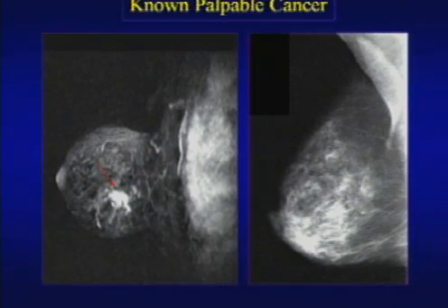So this is an example. A woman had dense breast palpable mass, which is mammographically occult. On the MR, again, everything I'm showing you is going to be post-GAD subtracted images. You can see this is an irregular homogeneous enhancing mass, which corresponded to the known cancer.